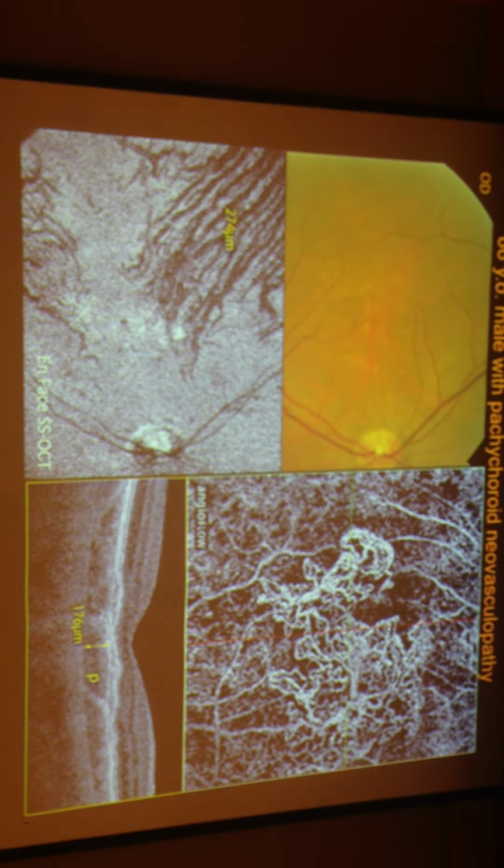Okay. And another one is the pachychoroid looks like a thick, sick RPE, which is similar to that in CSC, correct? Yeah, true. So it is like a spectrum of progression of a disease. The patient can start off with CSC, perhaps never been discovered, never been seen before, and then subsequently develop pachychoroid neo.